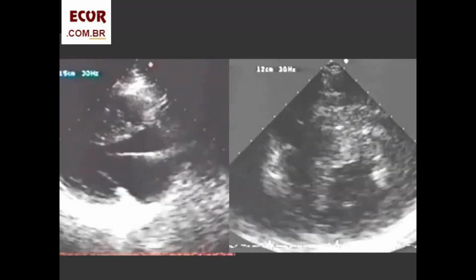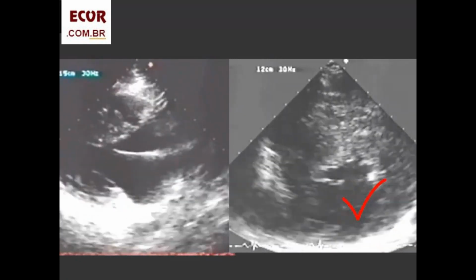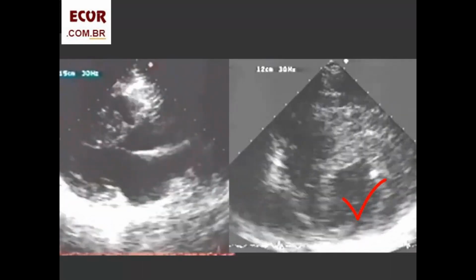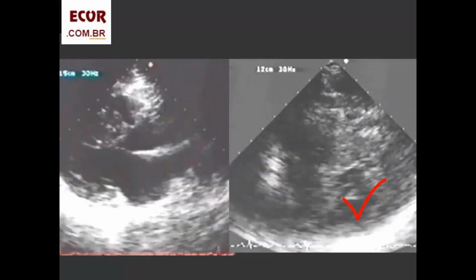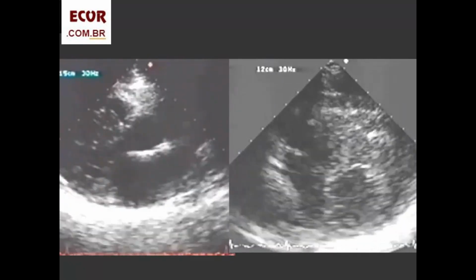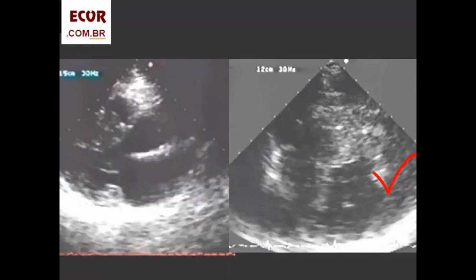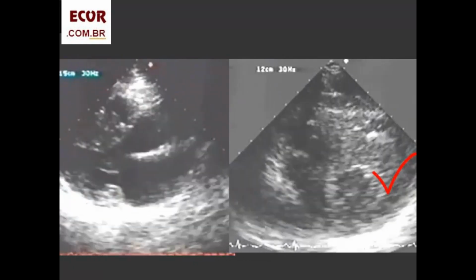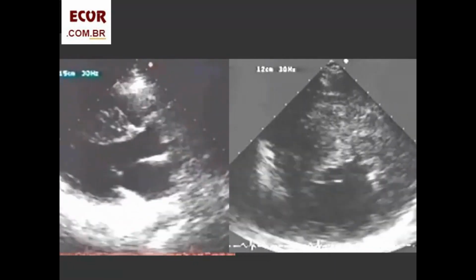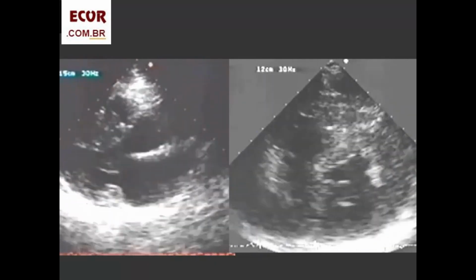However, we will encounter that always the inferior or posterior wall will be less thickened, but not necessarily than the IVS. The main hypertrophied wall may as well be the anterior or the anterolateral walls, or the whole walls from the inferior IVS to the posterior lateral wall, as seen in this case.